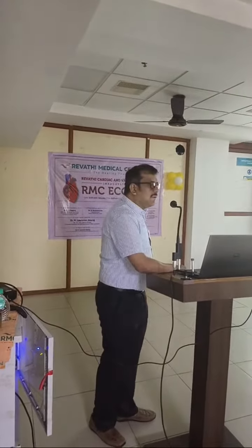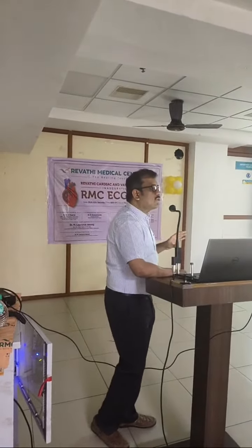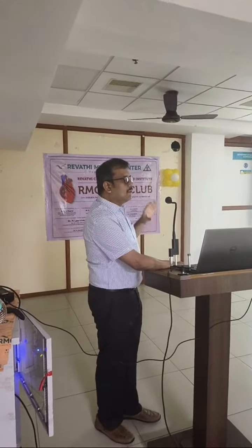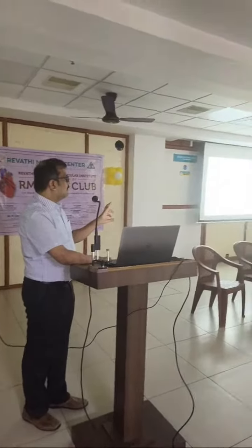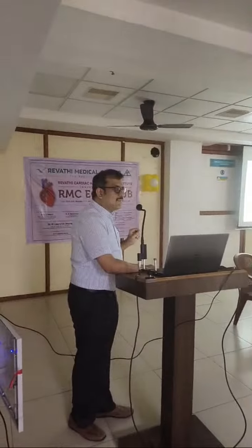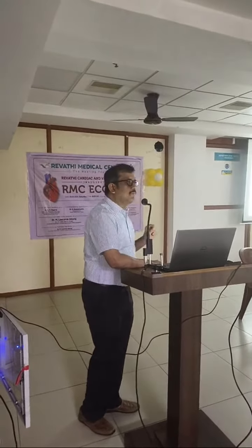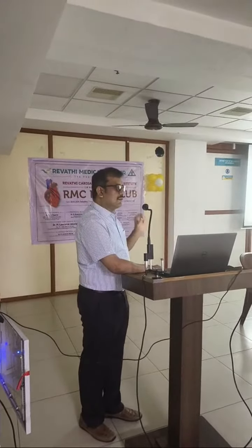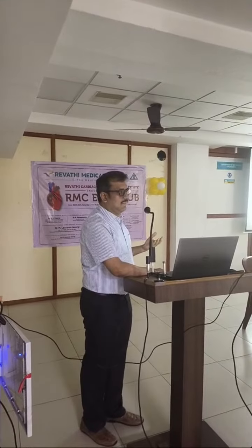If you have a patient with reasonably good T waves, most of the time your machines will give a good QTc interval. The one area where your ECG machines will struggle is to find out where the T ends. So what I always say is, whenever you are given an ECG and the QTc is prolonged, you measure the QT interval by yourself, because measuring a QTc interval requires a formula.